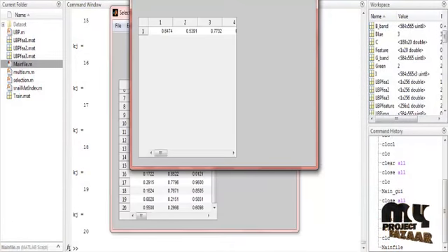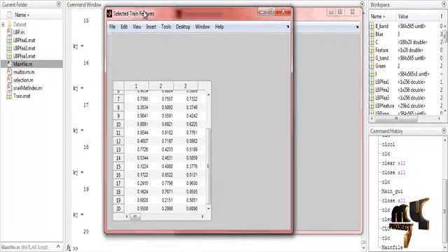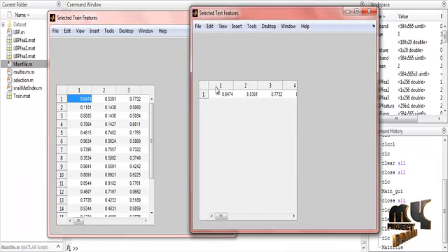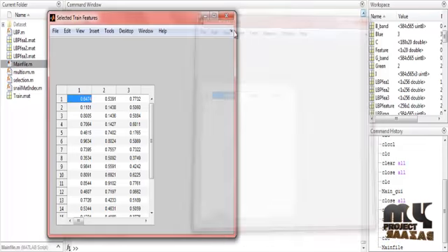In the next figure, the selected test feature. First of all, I will select the first image, so I will select the first value. This value should be displayed in the selected test feature. Both are the same. This is the selected train feature. These are the differences between the selected train feature and the selected test feature of the process.